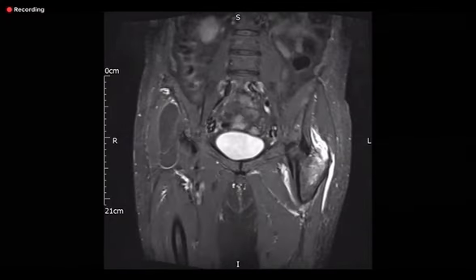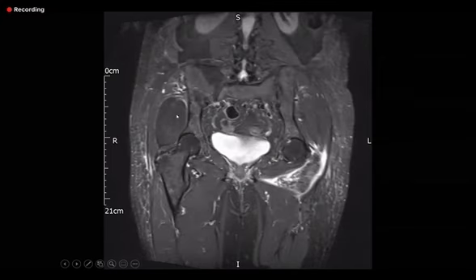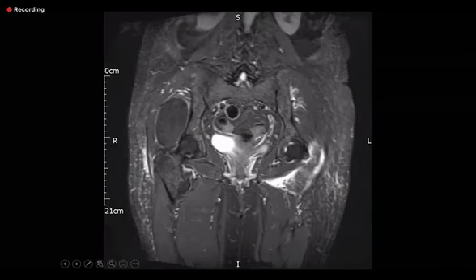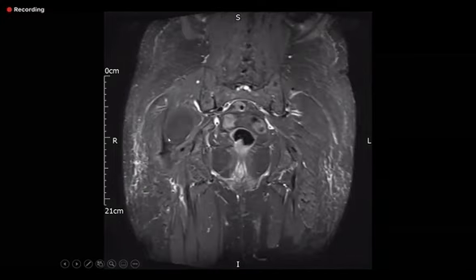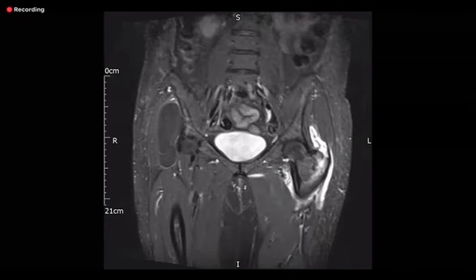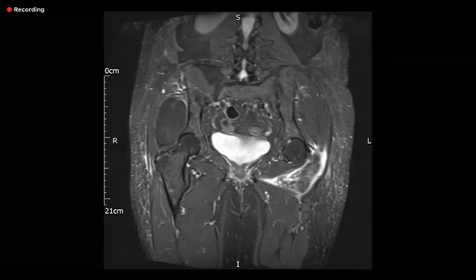What's happening on the right, that soft tissue which you were saying? So on the right side, there is a low STIR signal, fairly well circumscribed lesion lateral to the femoral head, the acetabulum, and below the gluteus muscle, and there's some fluid surrounding it. This appears to have been present for a long time. I don't think it's something acute. I wonder if this is a Morel-Lavallée type of lesion, but it's quite deep actually. I'd like to take a look at further imaging. Okay, go to the next series.